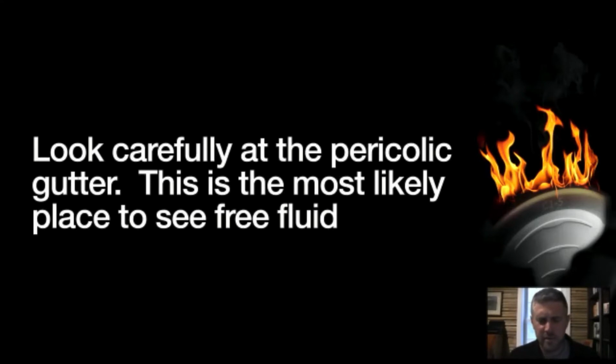This is the most commonly positive place where we see fluid in the belly, right? Make sense? Got that one? So let's move on with that one to our next case.